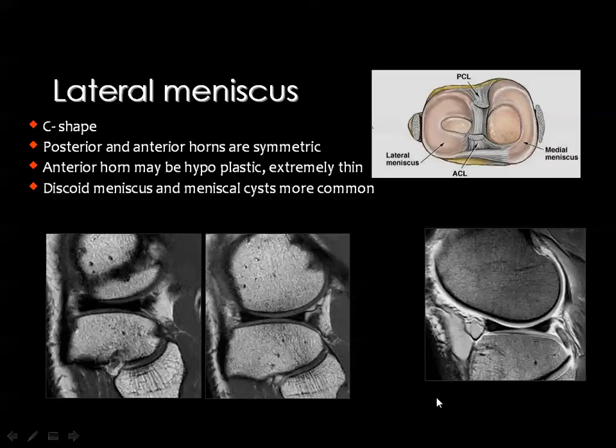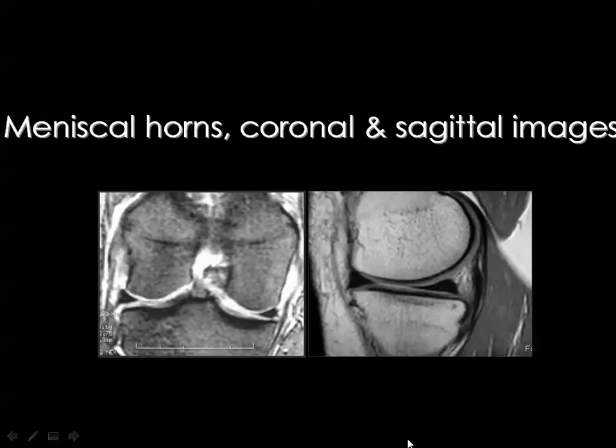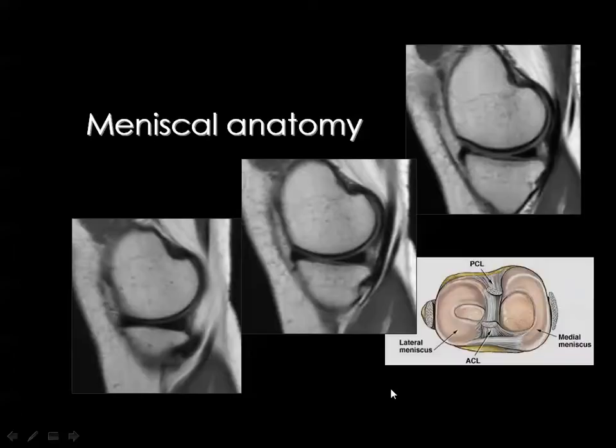So the lateral meniscus is identified by the fibula, by the shape of the tibia, and by the fact that its anterior horn is almost equal in size to its posterior horn, while the medial meniscus is identified by the shape of the tibia also, and you don't see the space for articulation of the fibula. The surface of the tibia on the medial aspect is flat, and there is no fibula, and the anterior horn is smaller than the posterior horn.